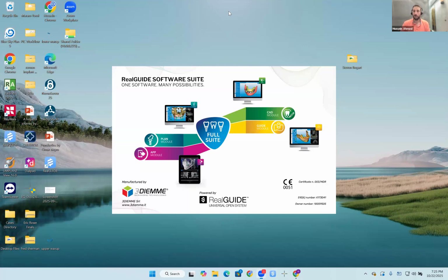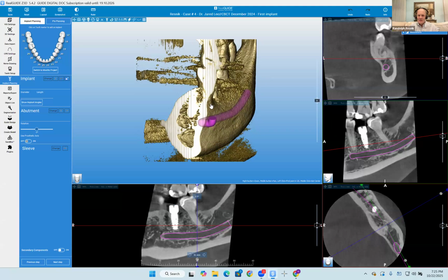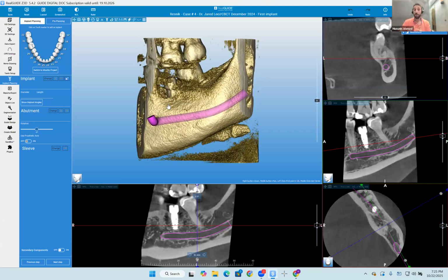Meanwhile, Professor, I'm loading the patient's CBCT for your review, sir. Okay. I saw you had multiple scans there. Yes, sir. To give you some history, Dr. Resnick, the CBCT I'm presenting right now was acquired back in December 2024, where the patient presented after placing that implant with some sort of paresthesia, if I read the notes that Dr. Lee left us.